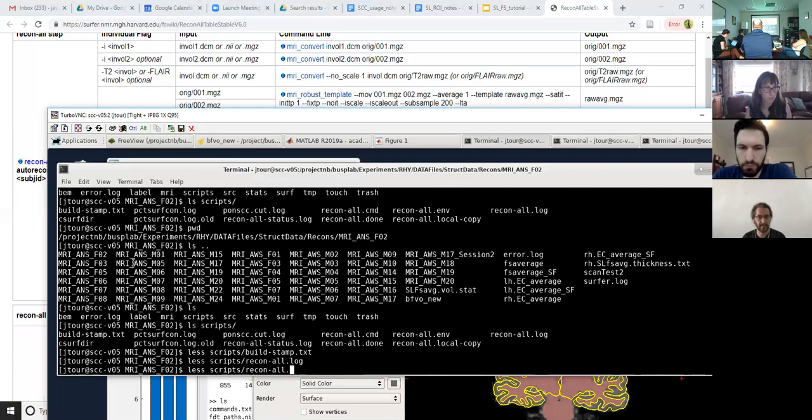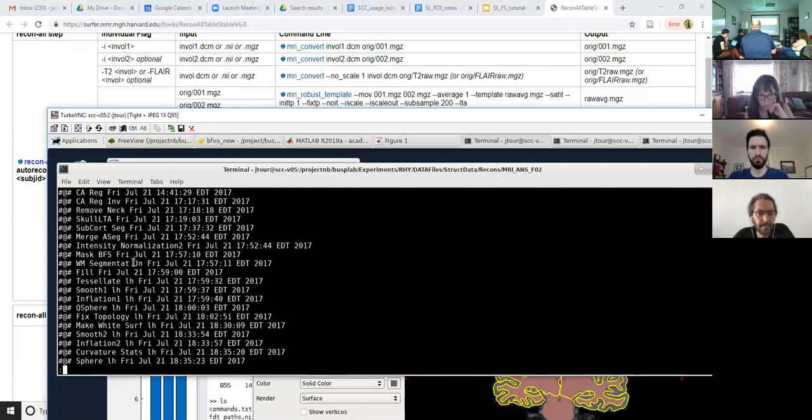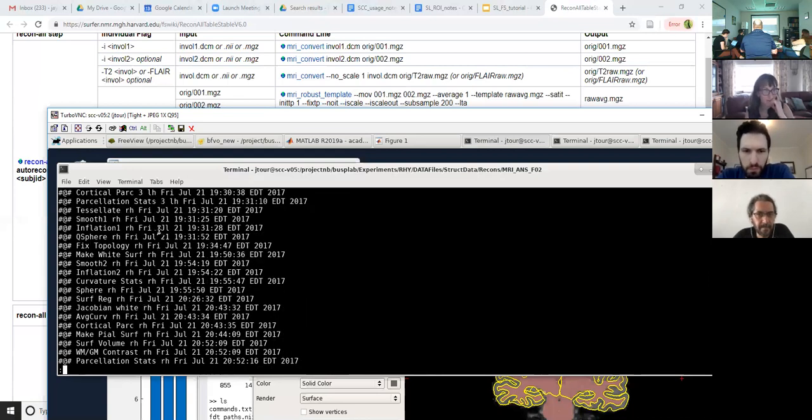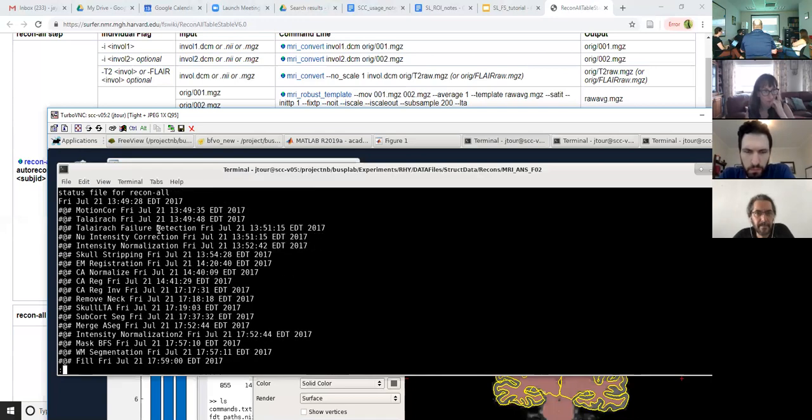Instead of giving the output, this just gives you a quick name for the process. If you see these processes that were run, here, this was way back in 2017. Actually, that's not so bad, not too old. If I keep going down, okay, bad pick here in that we did not have to rerun recon, but if we did, you'd see another recon-all for something like this.